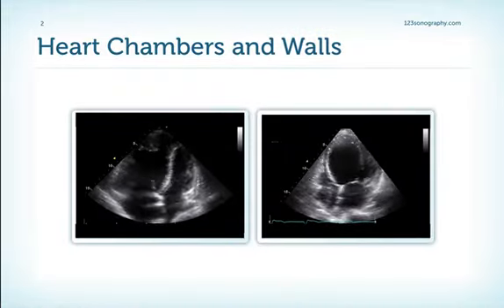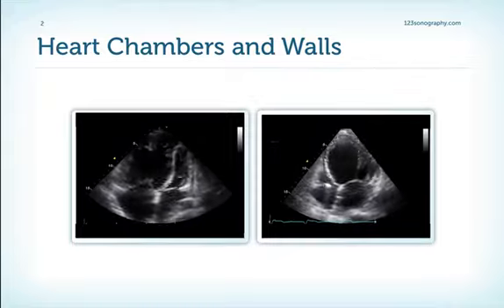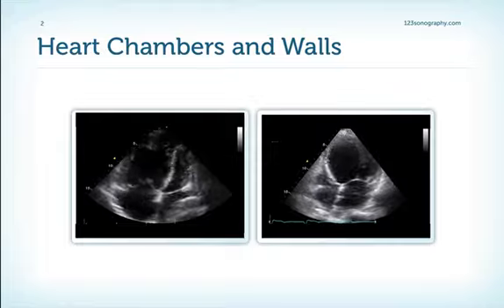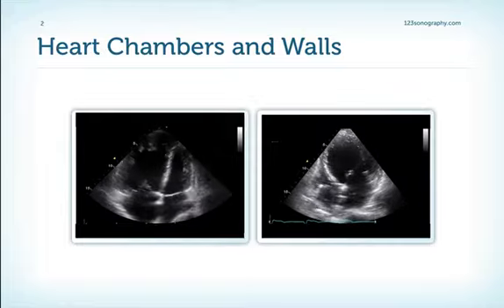Just by looking at these two four-chamber views, you will immediately recognize that these two patients have completely different pathologies. This is apparent because the heart chambers look different and because their function is different.